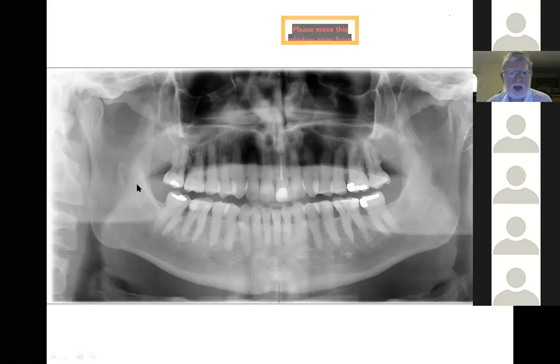We're looking at the hard palate sort of up across this region. And from here, you can see that extra black. And we've got this little sort of droopy lip shape of black all across here superimposed. If you were worried about this, by all means take periapical radiographs, but there's something here on this picture that I want you guys to pick up, something here other than looking at that and other than looking at that.